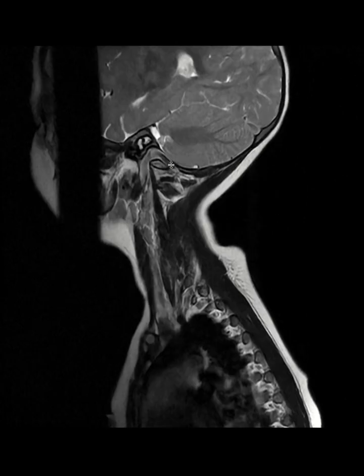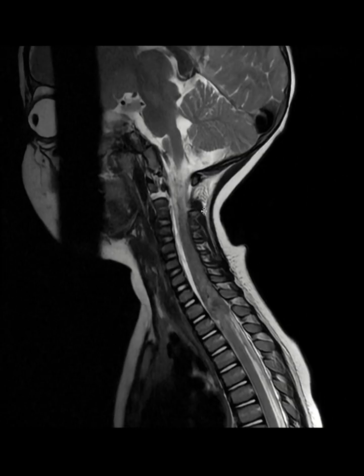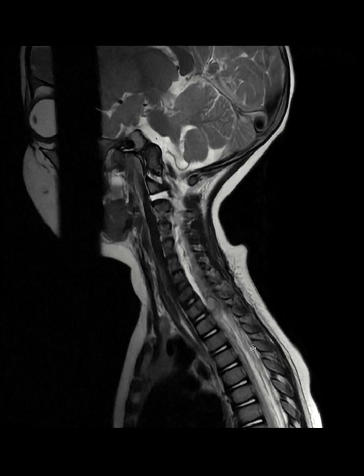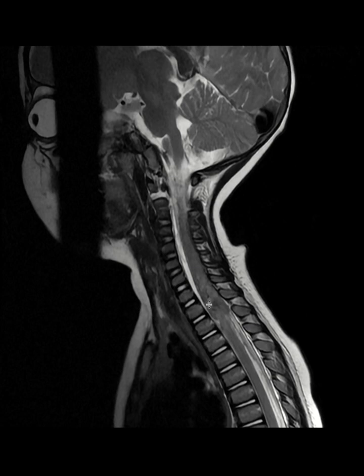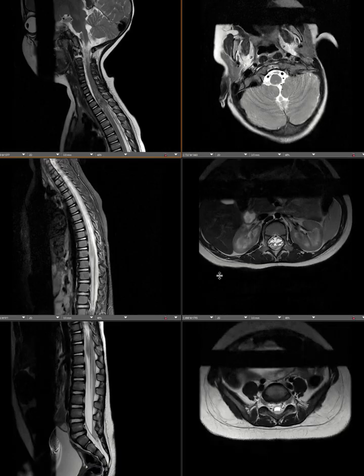The brain itself doesn't look that bad, right? Whatever we see in the brain looks pretty good. But when you look at the cervical spine and the cervical cord, up to here is just a start at the lower aspect of the cervical cord and also the upper thoracic cord. You see a lot of hemorrhage and a lot of avulsion injury and contusive injury in the spinal cord, and it looks like the diameter of the cord has almost doubled.